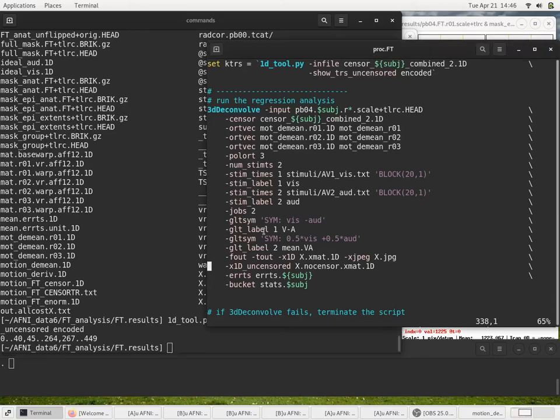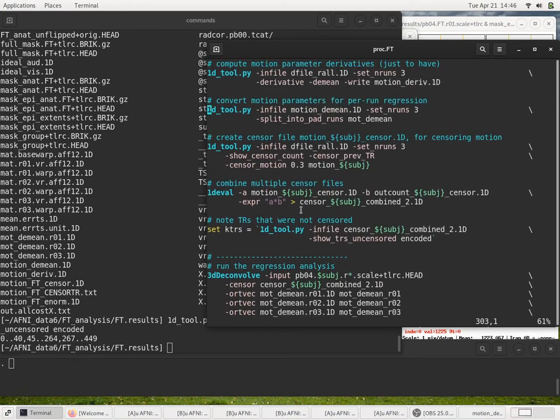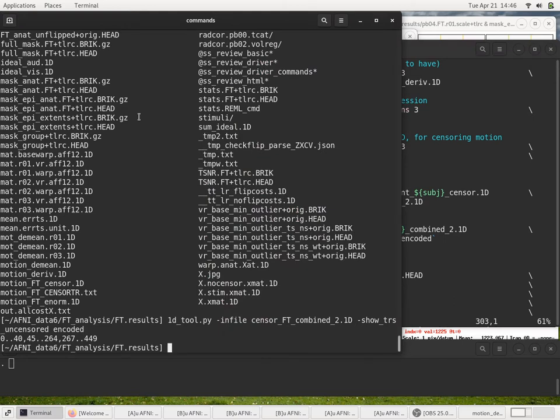Okay, getting into the linear regression, actually, I want to make one last comment before moving into that. And again, just to give help examples: if you want to do some of these things on your own, where do you come up with the examples? Just as a reminder, of course, you could run these programs.